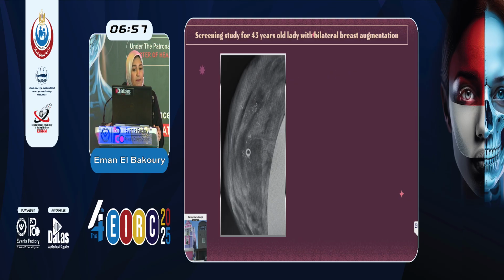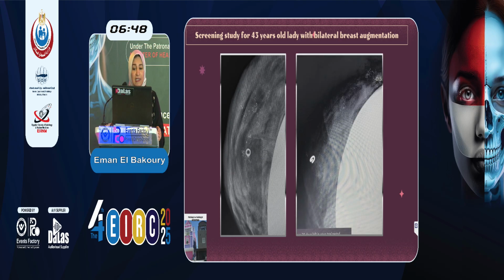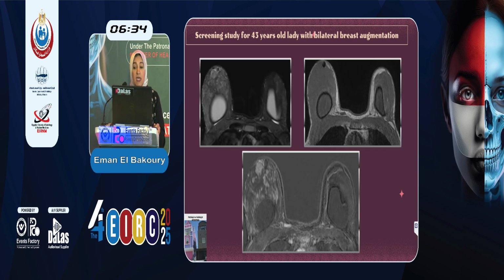I reviewed the mammogram, the post-clipping mammogram, in which the clip is well concordant with the suspicious calcification in one view. However, in the other view, the clip is abutting the calcification, which is fine, actually. Whenever we have a clip within 1 centimeter of the target, it's okay. However, with such benign pathology, we think of reviewing or repeating the pathology. And the same goes with the MRI, in which the signal void artifact of the clip is just abutting the non-mass enhancement caused by this calcification.